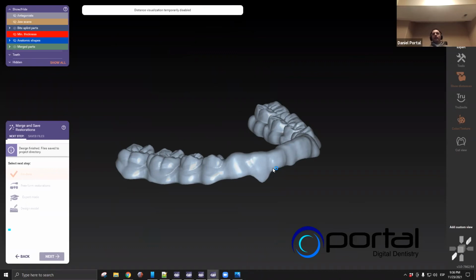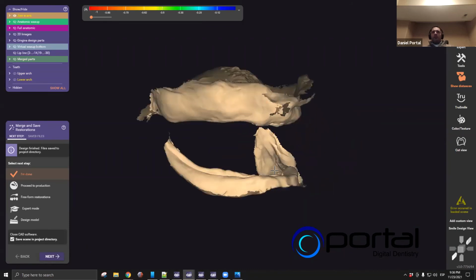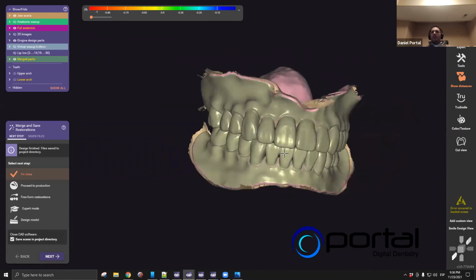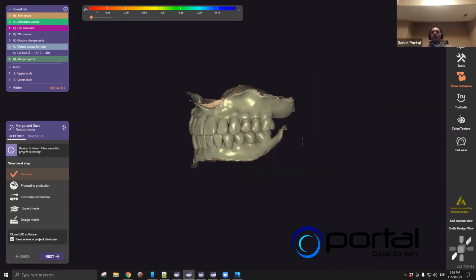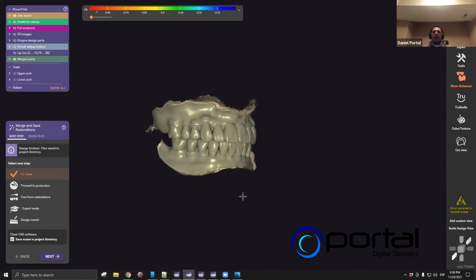Okay, now the last set of tools that I'd like to show you today is with this type of workflow that I mentioned at the beginning. So I am able to receive pre-op scans of the patient, and then I'm able to do my positioning, design the virtual gingiva, create immediate dentures, and those can be sent to the doctor for him to print or mill for immediate load. Those can be used by the doctor to establish a vertical dimension in case the patient was completely edentulous to begin with.